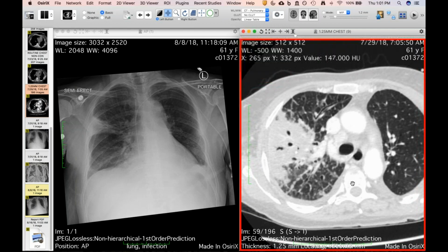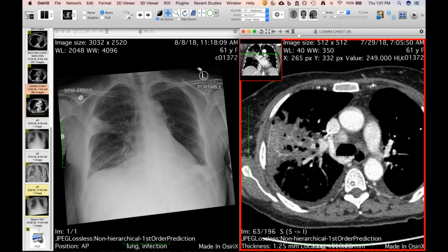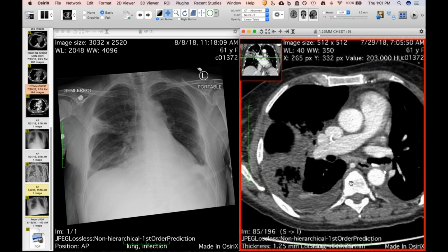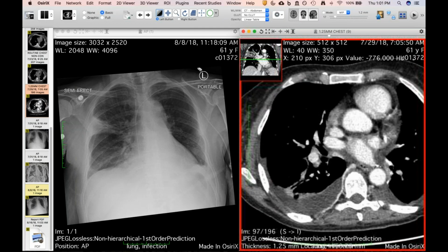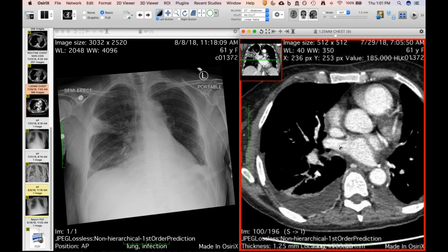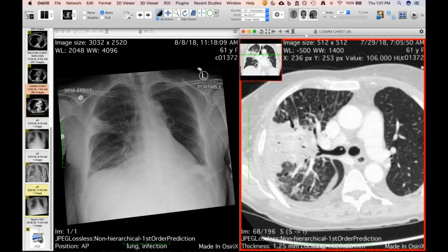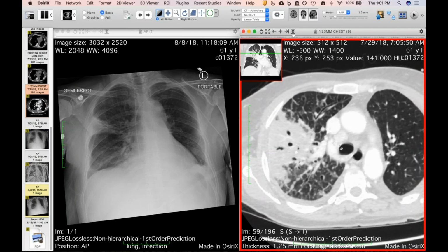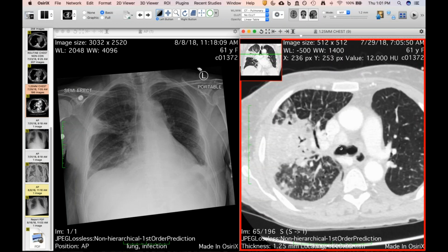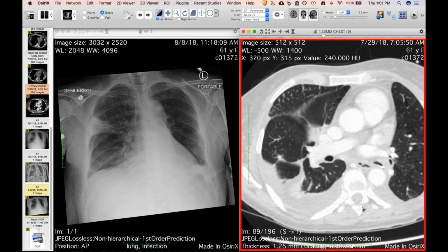So very strange. On the CT with the proper window, you can see that the pulmonary veins are not compromised centrally. Yeah, here's the superior pulmonary vein right here. Mm-hmm. And it looks like it's fine. Well, I think the best guess then, if the veins are okay, is that it must have just blocked all the lymphatics, all that swelling around the right hilum, probably just completely obstructed lymphatics, and it's just backing up. That would also predispose to the pleural effusion. So lots of inflammation and probably lymphatic compromise, but it's pretty fair.